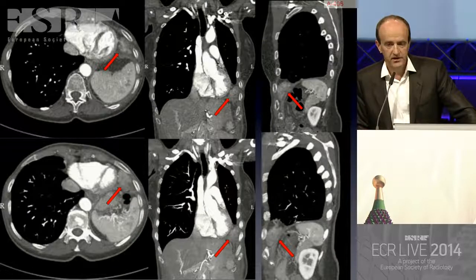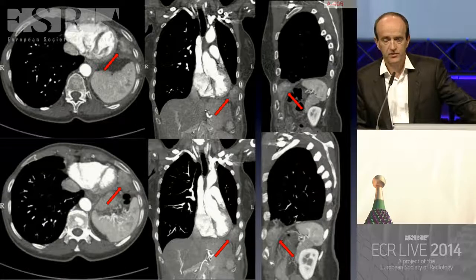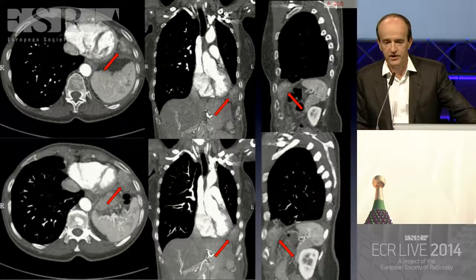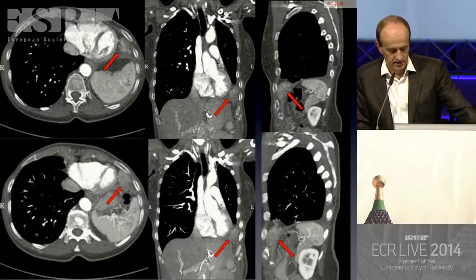And it's a typical case of lesion you miss because you look for another kind of lesion. Usually, tumors are not hyperdense, but hypodense. However, in case of carcinoid tumor, the tumor may be hyperdense and recurrence hyperdense as well.